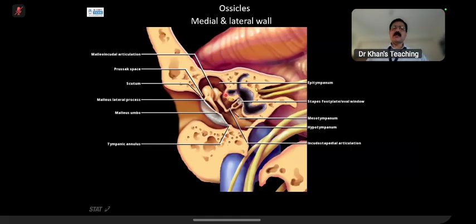There is bone here, and it is projecting, and in between the canal and the middle ear cavity is a bone, and this is normal. They will show you cases in which a cholesteatoma will be sitting here and will be causing fistulization of the lateral semicircular canal. So these are the key 3 points which you have to remember for your exam vis-a-vis any erosions, etc.